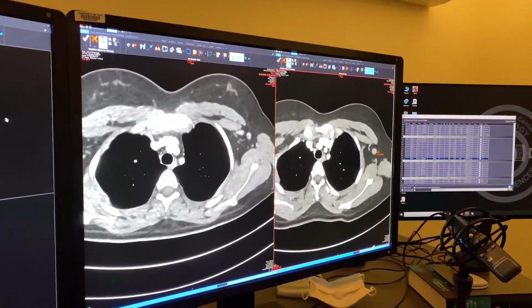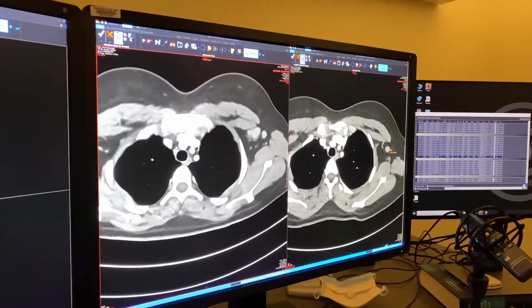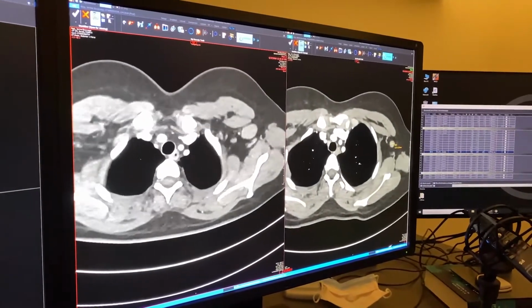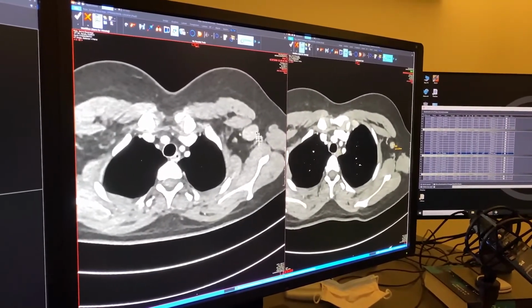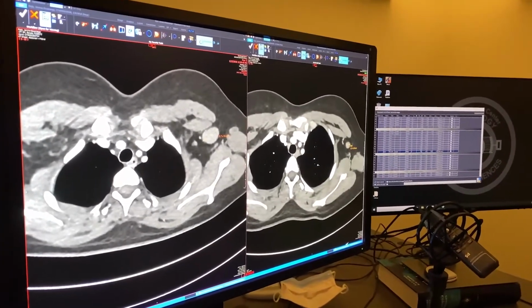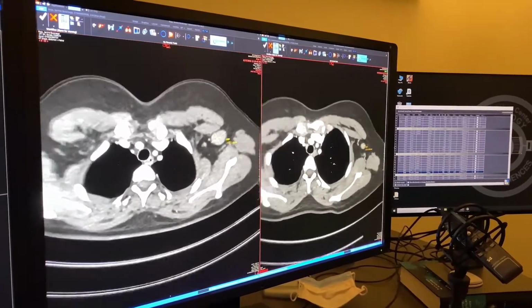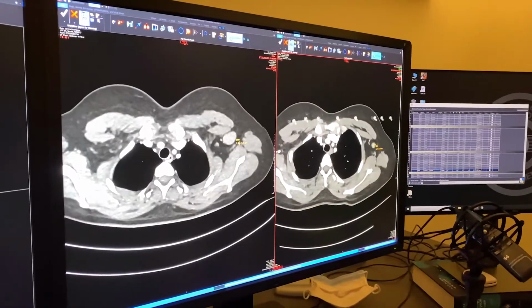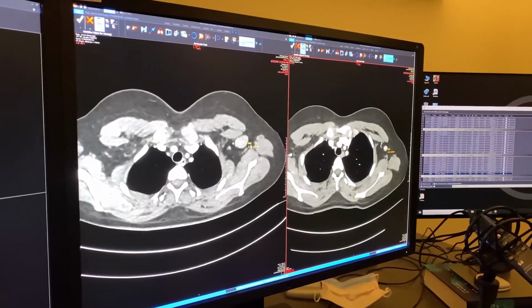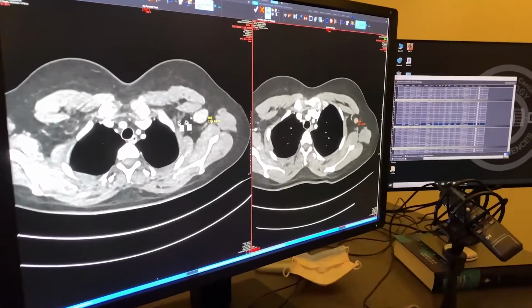So I'm going to break registration, meaning the machine is a little bit off the recognition of the anatomy. Now I'm going to bring this to the adenopathy that was there before, so you can see the proximity. It was much larger in the past. It's usually measured, but let's say it wasn't, then the radiology preprocessor or the machine in the near future, AI, will then go in and measure these two. And usually it would detect that the measurement has been made in this same area, but it's so much smaller, the automatic recognition doesn't believe that that's the same lesion.